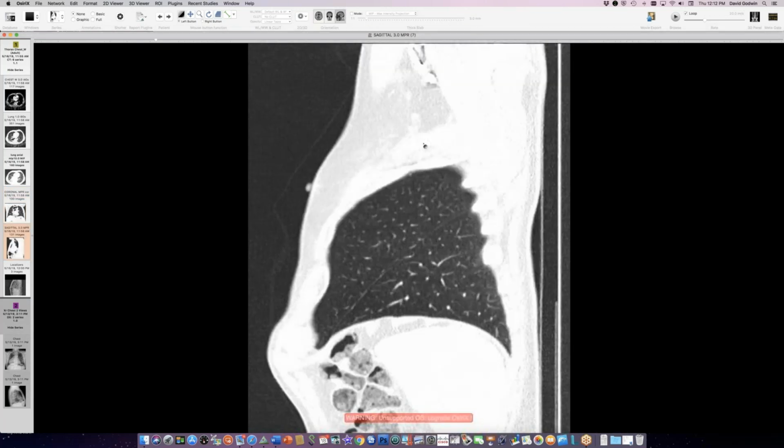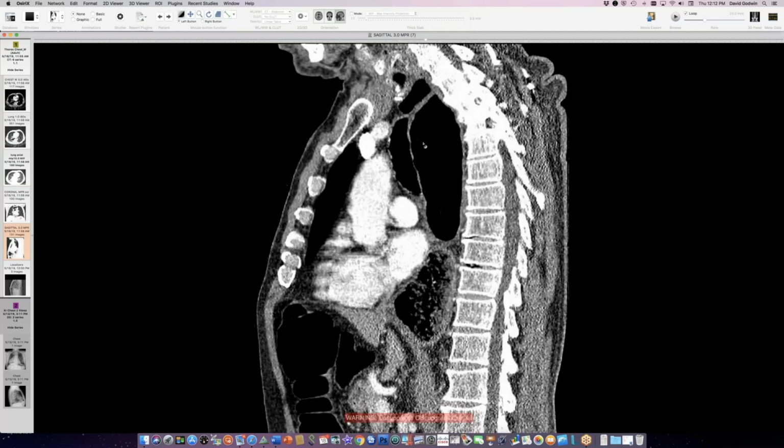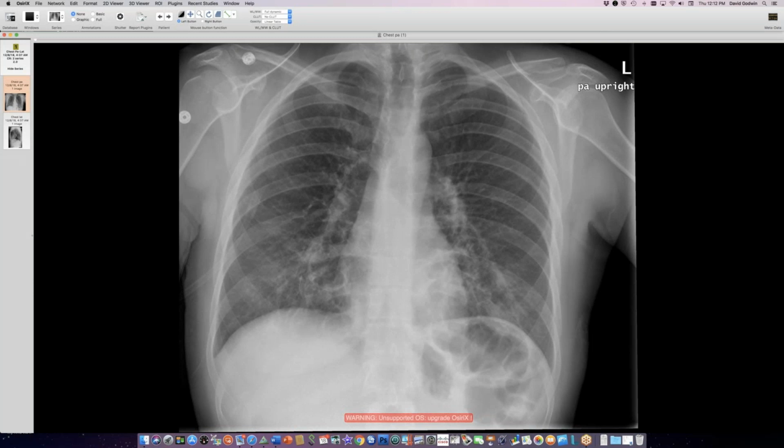And pull up the SAG. So abnormal esophagus, I'm glad it's not my esophagus. Okay, and then this is a person who has a dilated central airway. So notice the little corrugation here and the dilation of the trachea and bronchi.